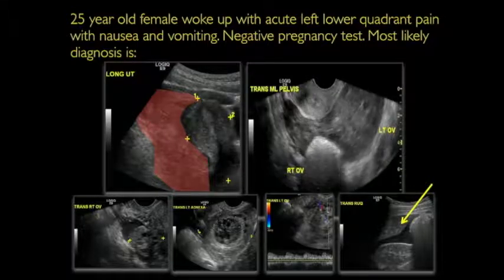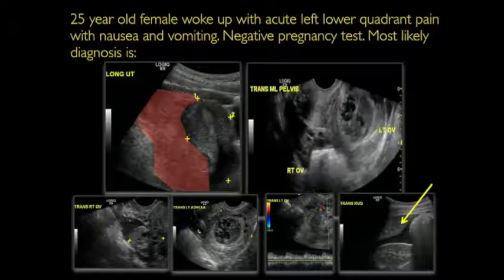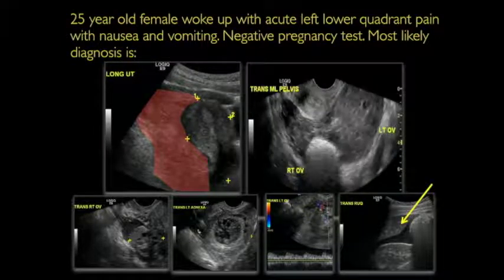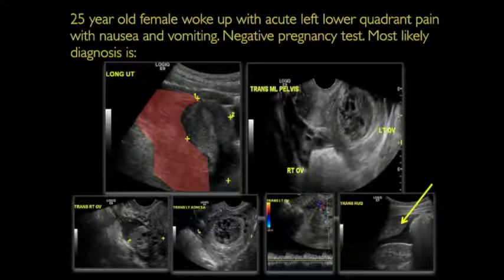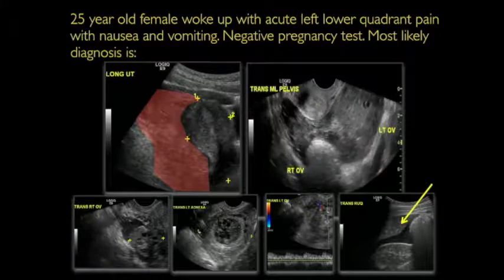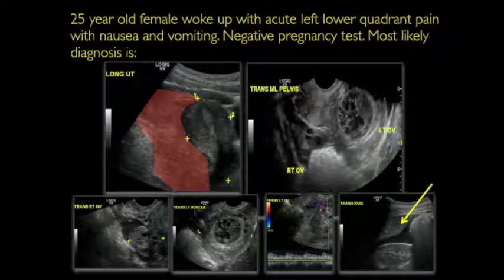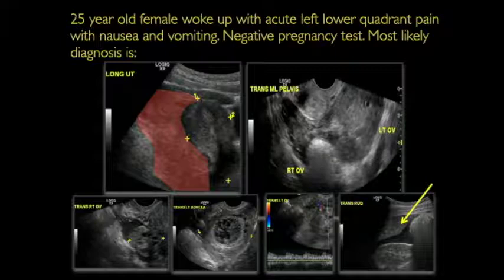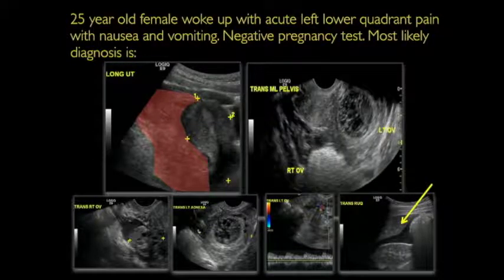So in this case, with a proper clinical history, this is almost certainly just a simple hemorrhagic event from a physiologic hemorrhagic cyst. Now, the residents might say, well, pus and blood are supposed to look the same in the pelvis or really anywhere. How do I know this is not an infectious process? It's unlikely to have this much material within the pelvis and the patient doesn't have any symptoms of a really severe febrile illness.